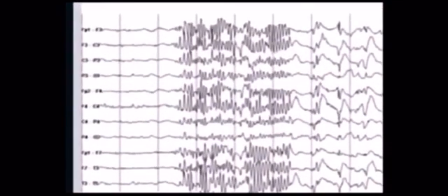What about here? So you see a very fast frequency here. This is out of sleep, followed by some slow spike and wave discharges, maybe 1.5 to 2 hertz spike and wave discharge at a slow frequency, and this is the fast activity. This is called paroxysmal fast activity and something that you see in patients with Lennox-Gastaut syndrome. So in patients with Lennox-Gastaut syndrome during sleep, you may see paroxysmal fast activity.